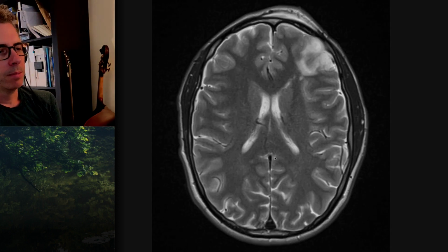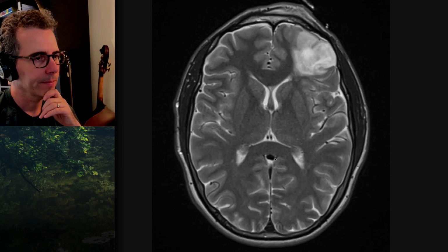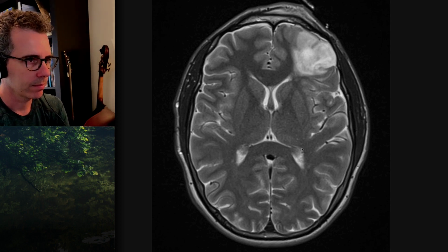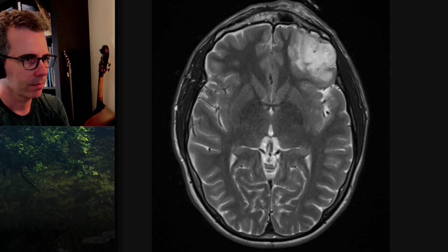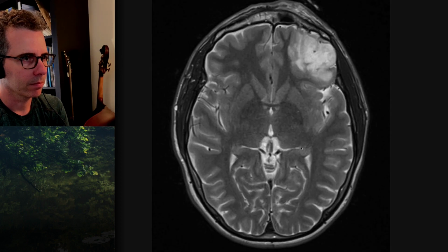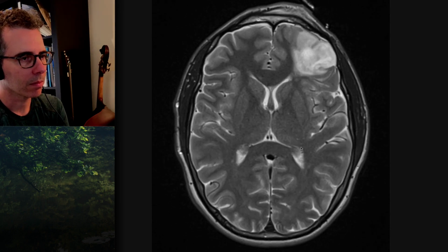Okay, so we'll start with the axial T2 that you've got there. There's increased T2 signal in the left frontal lobe that has some septations within it and some low T2 signal foci in it as well.